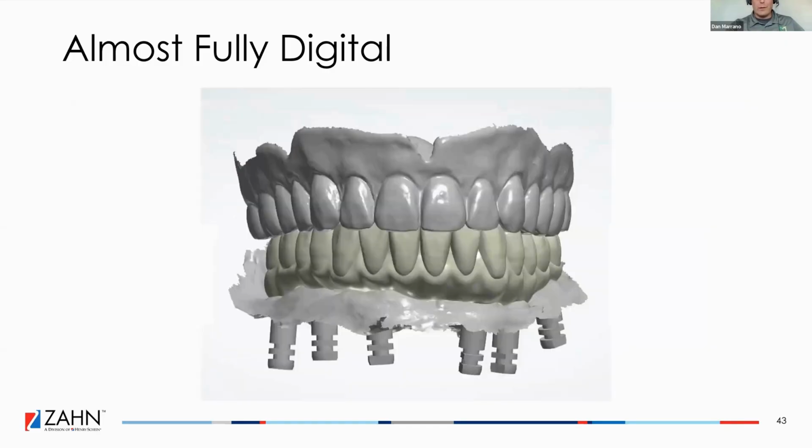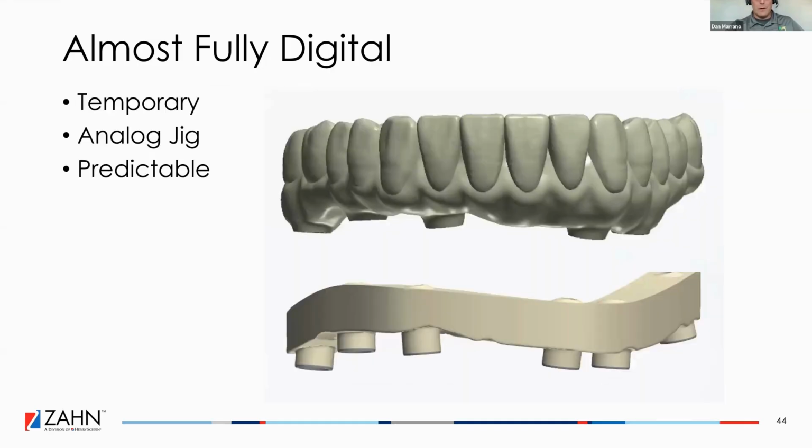And here was our design for that case. And this is what I delivered him to try in. The direct to multi, lower full arch, and a verification jig. This was a different style we made at the time.